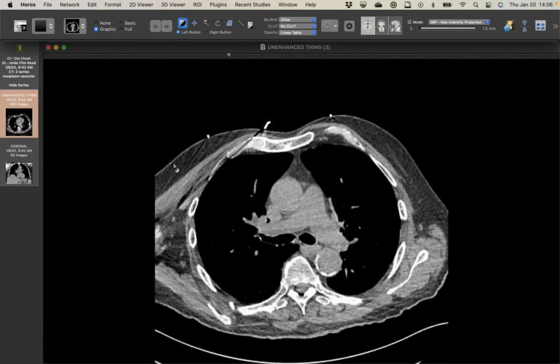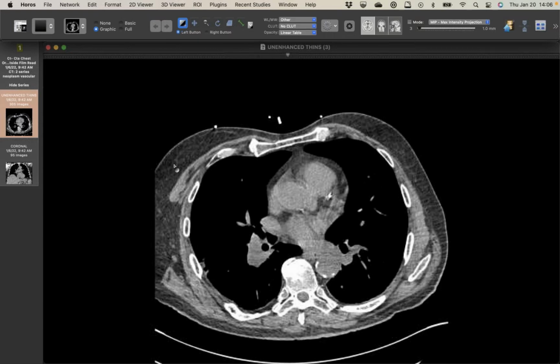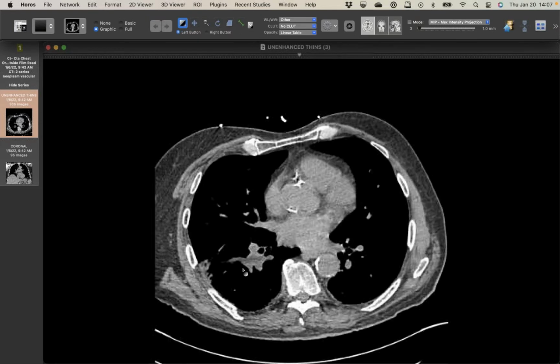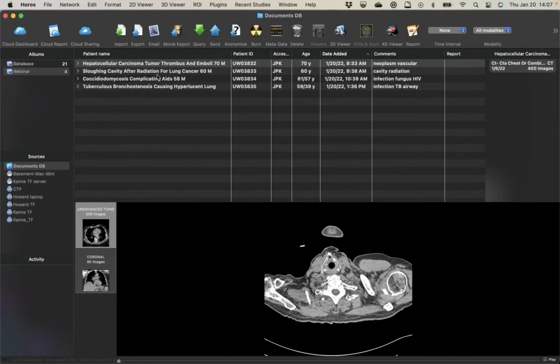There are reports of PEs, usually hyperdense, but in this case it's hypodense relative to blood pool. Right. And an MR might be helpful in distinguishing bland thrombus from tumor thrombus. There's even what looks like a little infarct right here in the right lower lobe. Yes. Okay, that's the first case.